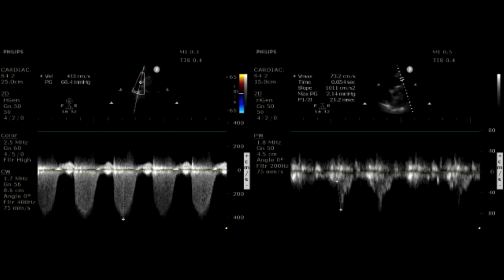In patients that have a more chronic pulmonary hypertension type situation, the acceleration time could still be pretty short, but the downslope of the spike is a little bit more delayed. So you'll have the flying W sign or the spike and dome. The spike is not quite as sharp. Okay, so the point at which the waveform reflects back from the pulmonary circulation back towards the right ventricle is delayed in patients that have chronic PH, and therefore you will see a more gradual decline of the spike, if you may. So that's sort of the difference.